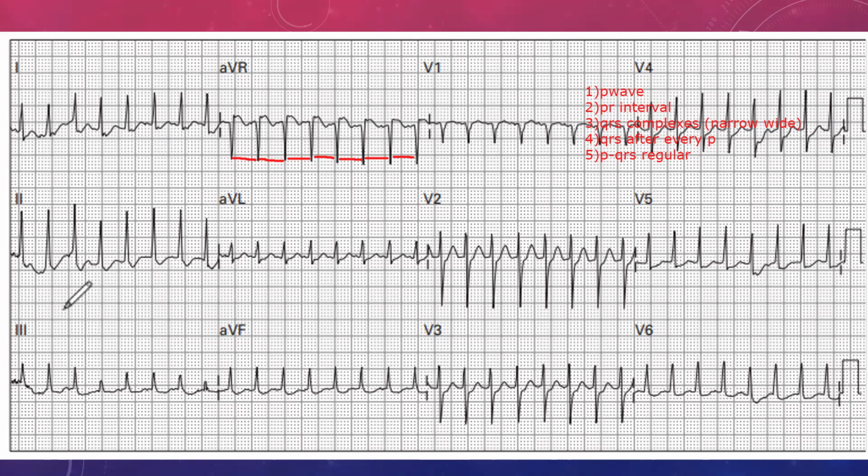Our patient has come in with narrow QRS complexes. In other words, they have a tachycardia, but this tachycardia is coming from above the ventricle. So whatever's stimulating the tachycardia is coming from above the ventricle. Does anybody want to take a guess as to what it may be? Or I'm not sure if everybody's shy today, that's fine as well. But I'll give you a minute to think about it.